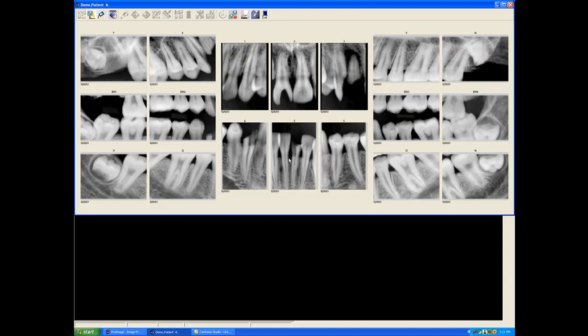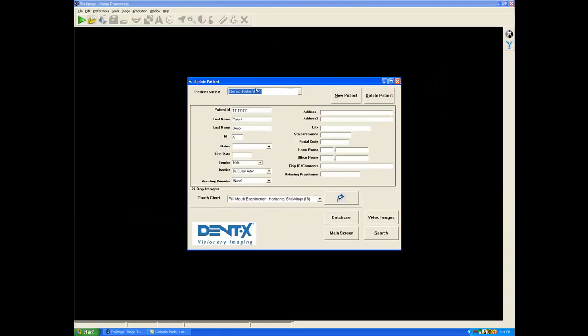out the front. This is very important because if you don't orient the sensor in this way, you'll get roots facing unexpected directions, and you might lose track of exactly where the teeth belong, which is not a good thing. So this is something that you definitely want to always keep in mind when you're placing the sensor in the patient's mouth, regardless of what positioning aids you may be using, that kind of thing. So for now, I'm going to exit this chart for a moment.